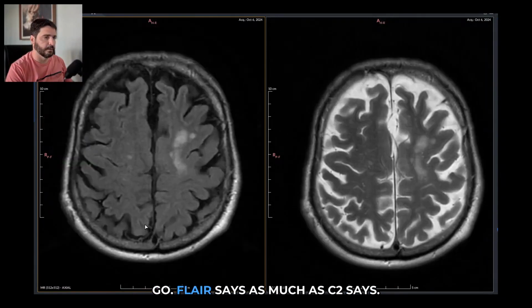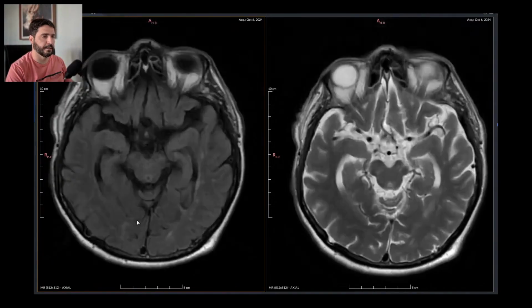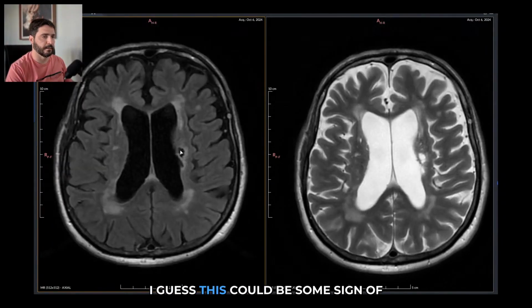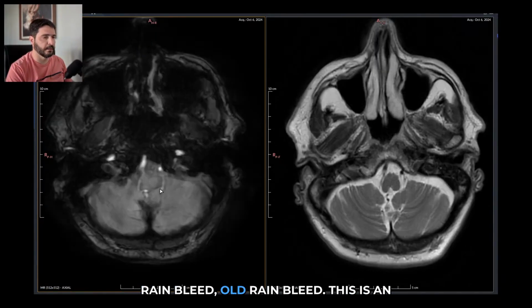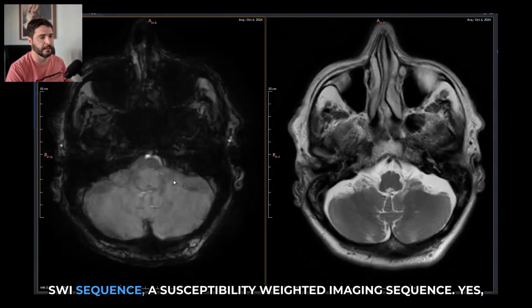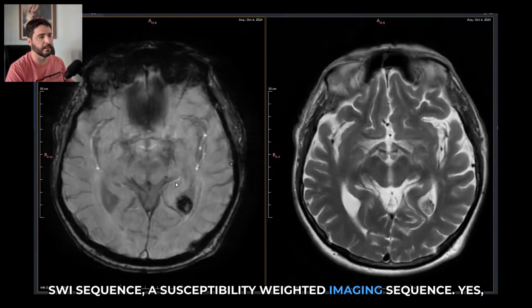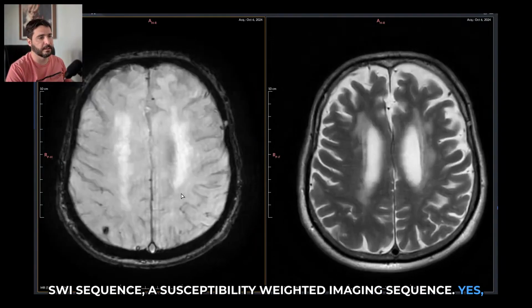Let's go. FLAIR says as much as T2 says. I guess this could be some sign of brain bleed, old brain bleed. This is an SWI sequence, a susceptibility weighted imaging sequence.